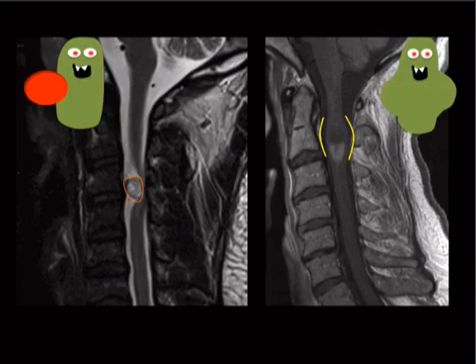that is extramedullary intradural, so schwannoma, meningioma, neurofibroma, drop mets. Drop mets probably going to be multiple. Schwannomas and meningiomas, I think, are really hard to tell apart. If you're forced to pick without anything else, schwannomas tend to be a little bit more common there, and they will envelop the nerve root. Meningiomas will not. The dural tail, like if you can see a clear connection with the dura, that's a classic finding for meningioma.